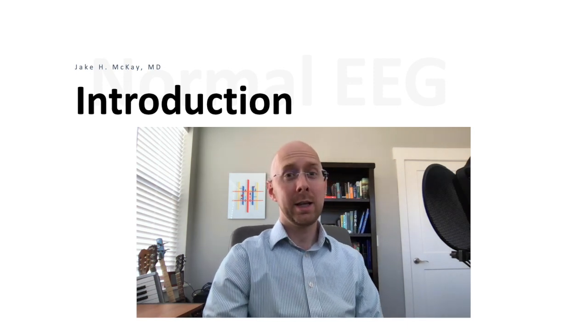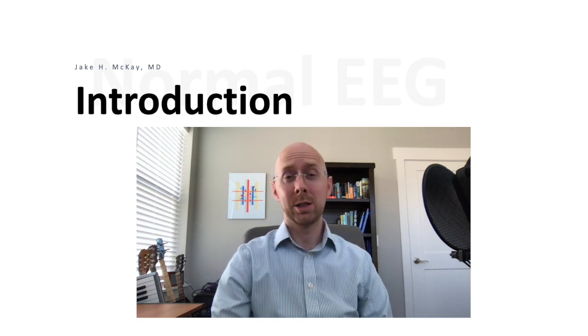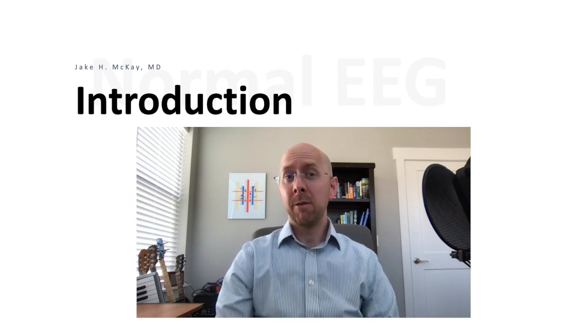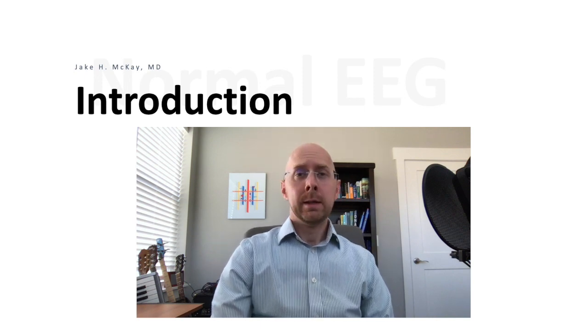This is an exciting episode because we will focus on normal awake and asleep EEG. Understanding normal EEG is absolutely essential to mastering the art of EEG interpretation. Without a thorough understanding of normal EEG, you may be fooled by normal variants of a dynamic brain.